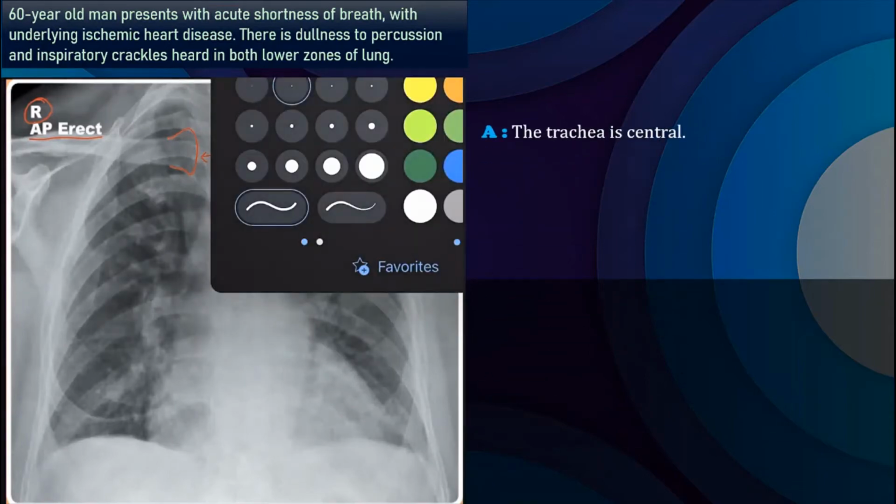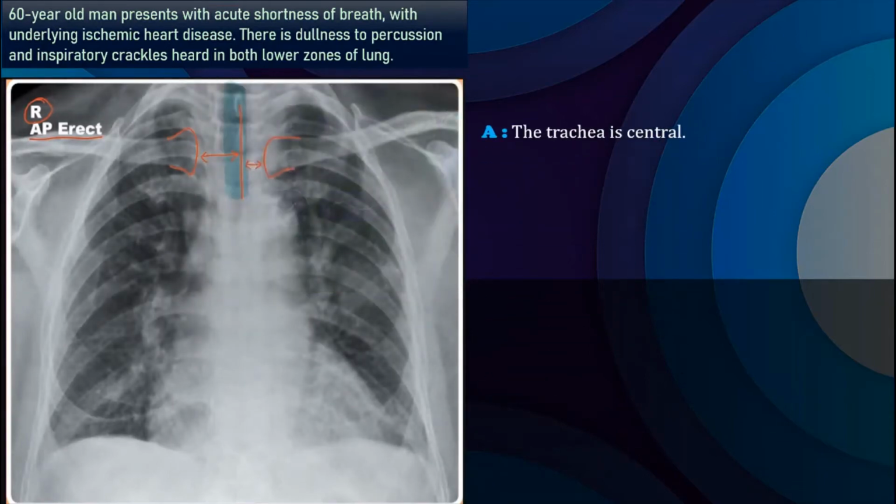So you're looking into the lungs. The most obvious abnormality that I can see throughout both lungs is some kind of opacity, but it's a very fine line. So this is what we call reticular shadows, or you can call it fine linear lining as well. But in a proper term, you can call them interstitial opacification. This happened due to too much water being accumulated in the interstitium of the lung.